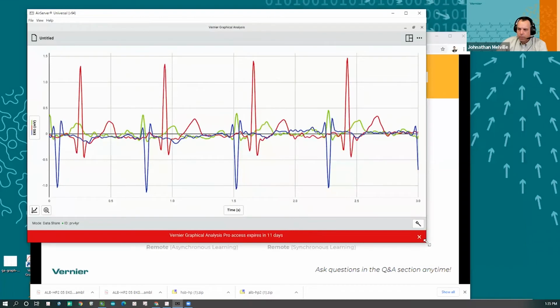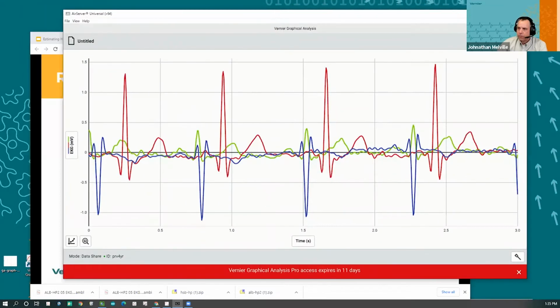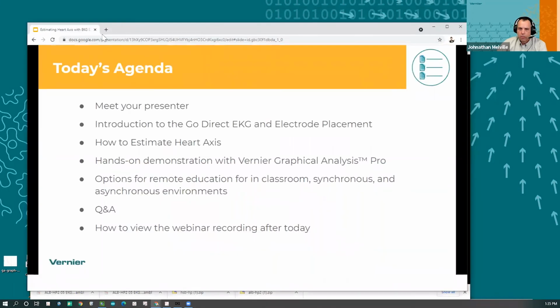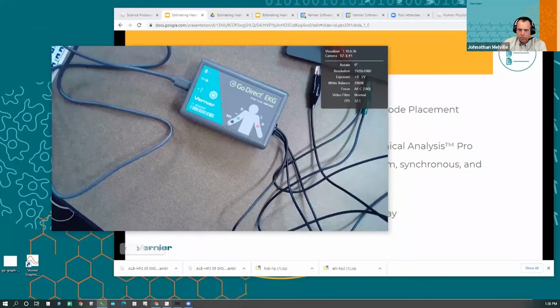So one of the really nice things of graphical analysis, just to let you know, is you can interact with the y-axis here. So if you interact with the axes, oh, that's AirServer. Let me just get rid of that for now. And hold on. Minimize this. That's interesting. It went away. Hold on.